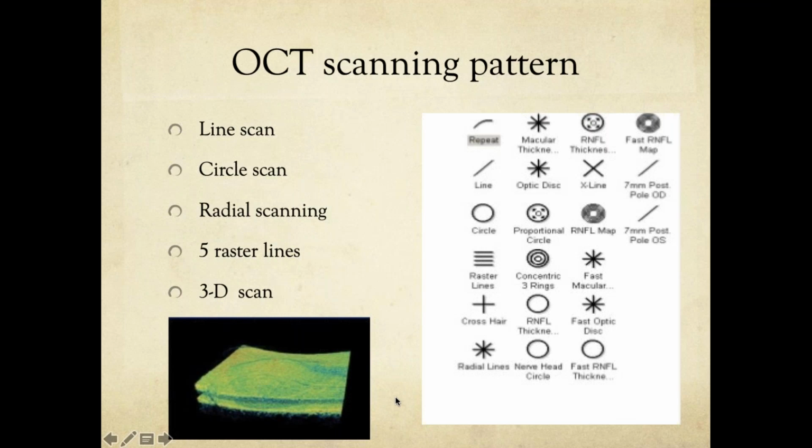Another 5 months, the patient still has vision of 6/24. But as you do the OCT, most of us have the habit of only analyzing the central macular thickness, and it might just show 245, 246, 247, or 244, but the decrease in the vision is not explained.